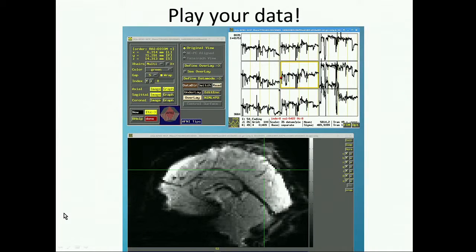And what I wanted to show is a video of, let's see if this actually works. No, it doesn't. But this is AFNI viewing an fMRI data set. You can get a similar view in FSL, but the point is to get a view where you can see the graph and a view where you can see the image. Especially if you have signal modulations that look like this, you should jump to these frames and see how the images are affected.